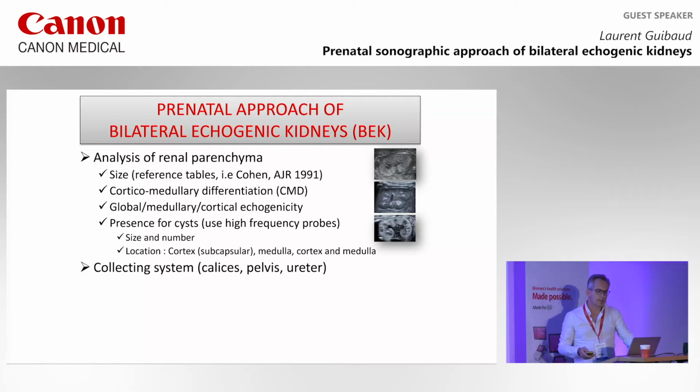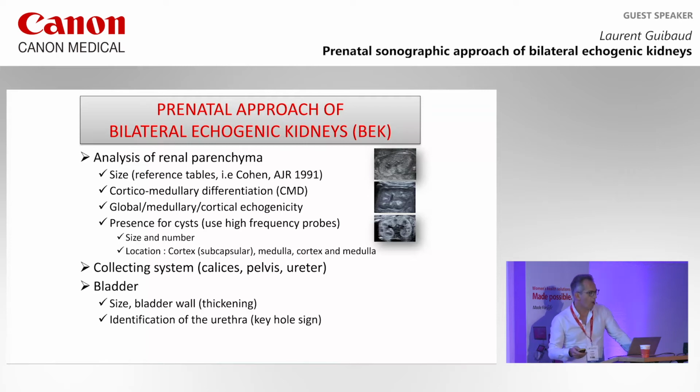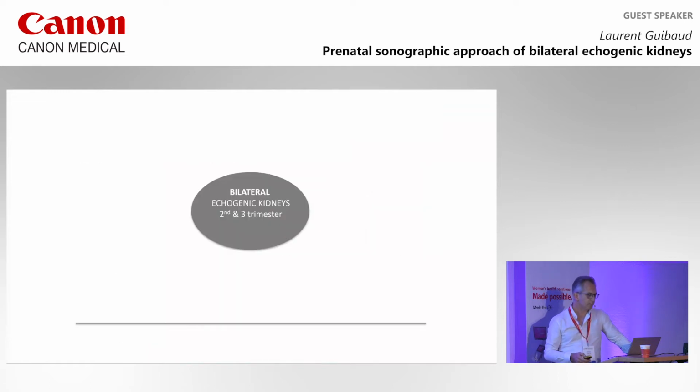Well, how is the collecting system? Is it dilated or not? How is the bladder? Is there any keyhole sign or not? And how is the amniotic fluid?